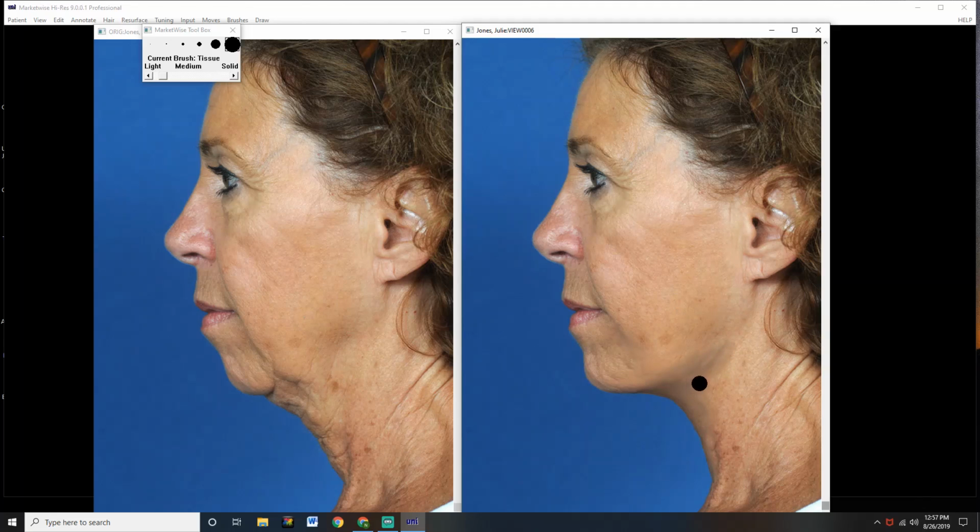Sometimes even tears, because they're so happy to see that what they have in their mind is also what you see as the possibility for them. So just a little bit of light drawing, light sketching, clicking down in the area of the color that I want and dragging it into the color that I want to change, and we are virtually there.